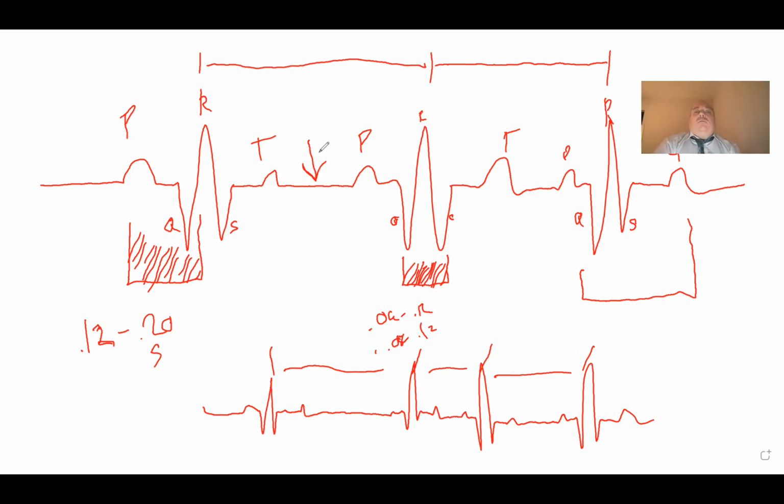All right. Now, another thing we want to talk about is where the QRS ends, right here, that would be there, and right here, that would be here. That is what we call the J point, okay? J point's important. J point is where the QRS pretty much terminates, and we want to compare the J point in relation to the baseline, which we just mentioned how to find.